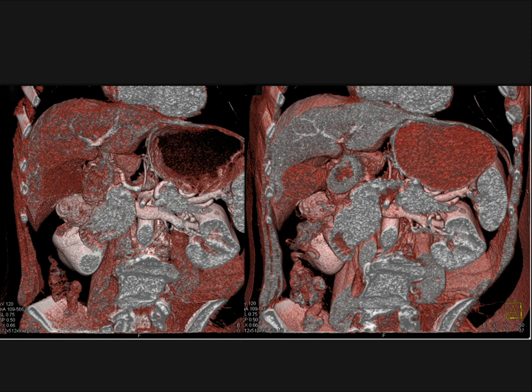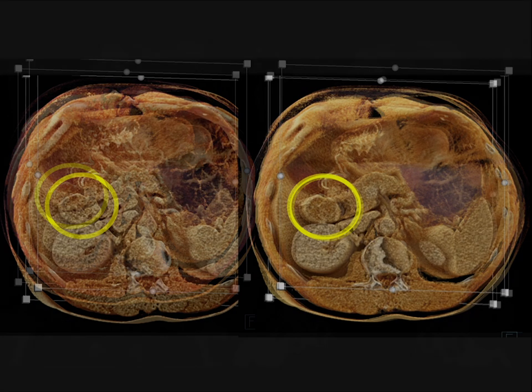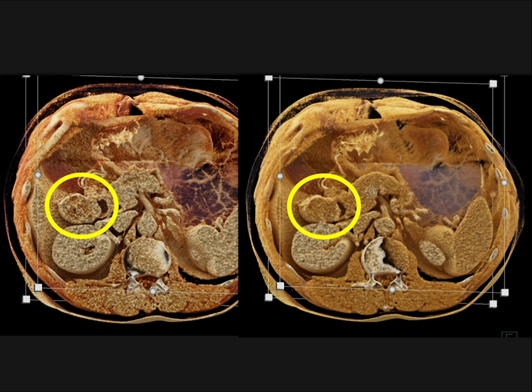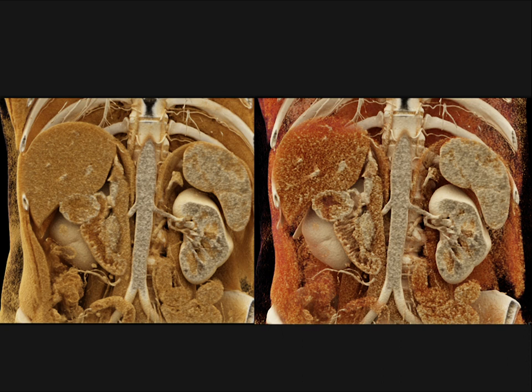When you see a lesion that's in the lumen, but mainly exophytic, wherever it is in the small bowel, you better be thinking about a gastrointestinal stromal tumor. And here's another set of images of that. I did this with volume rendering, classic color coding, which you can see here, which shows it okay, nothing spectacular. But there it is on the cinematic. A really nice presentation, a really good look at that exophytic tumor. And if you've seen this before, you should be able to make the diagnosis. I don't think it's that tricky a diagnosis. Again, beautifully shown on the cinematic in a coronal 3D perspective.